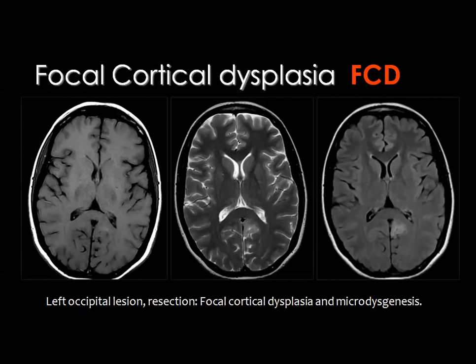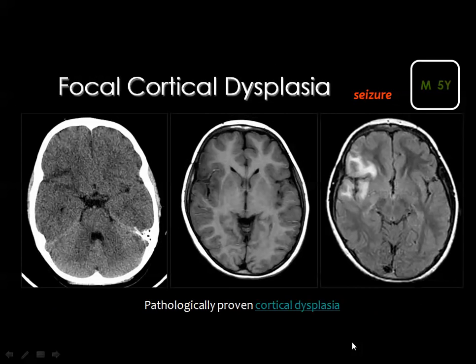And you see here an area of focal cortical dysplasia, which is not usually appreciated well in the T1 weighted images, but you can see it in the T2 and in the FLAIR images as well. And because sometimes the focal cortical dysplasia may simulate a neoplasm, especially the diffuse type of astrocytoma, then you can see a lesion here. And this lesion is hardly seen by CT, but it can be appreciated in the MRI T1 weighted image, but it is well demonstrated by the FLAIR images.